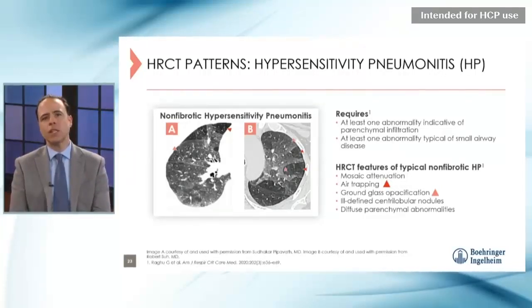So that's one of the key reasons that we do an expiratory phase on HRCT for ILD patients, because you may be fooled by an inspiratory scan. You may not see the air trapping at all. So quite important to get that.